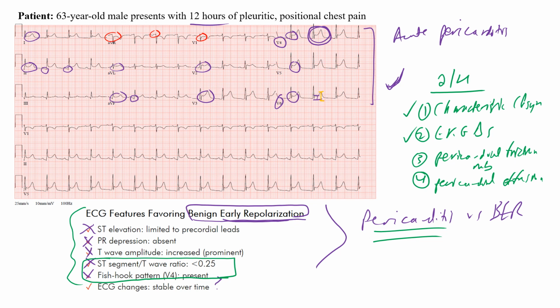And then the EKG changes over time. They tend to be stable with this. Remember, we saw the different patterns over weeks with pericarditis. Okay.